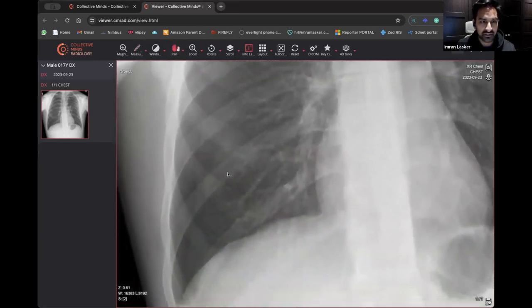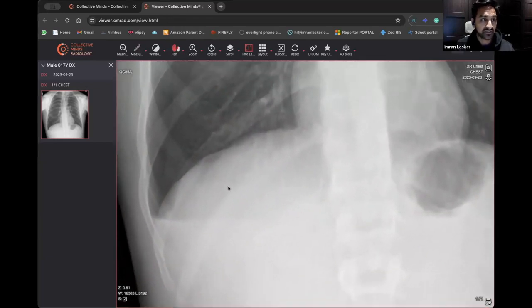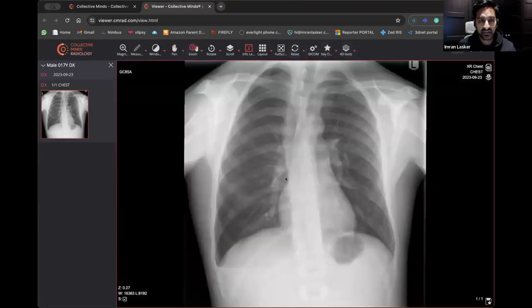And actually, on this particular X-ray, I can't say that we've seen any fracture, but there is definitely a fluid level there. So we do have to highlight that. If I was reporting, I'd say that there is a right-sided pneumothorax. I'd measure the pneumothorax depth, and I'd also say that there's some fluid within the right hemithorax. In the context of trauma, this could be a hemothorax. It could be anything really, until someone tries to put a tap in and with a bit more clinical information. But the main things you can really say is, 100%, there's a pleural effusion, and there is definitely a right-sided pneumothorax.